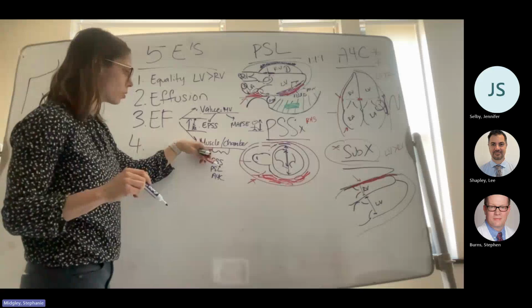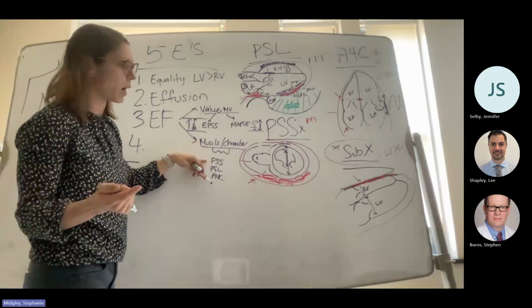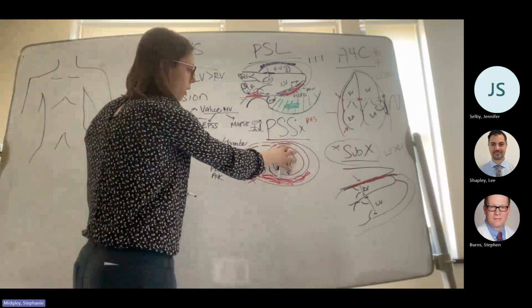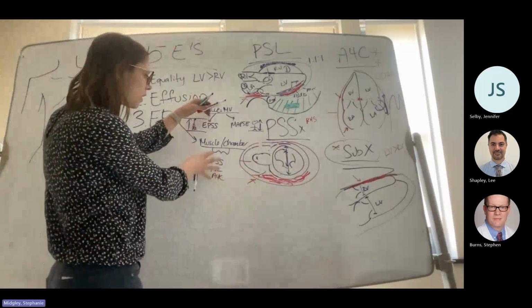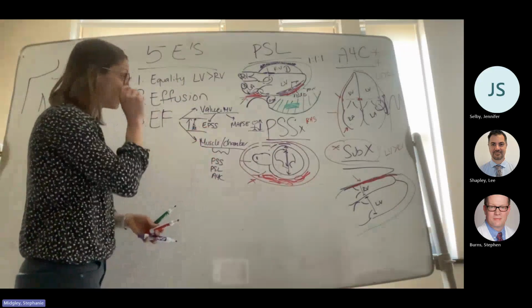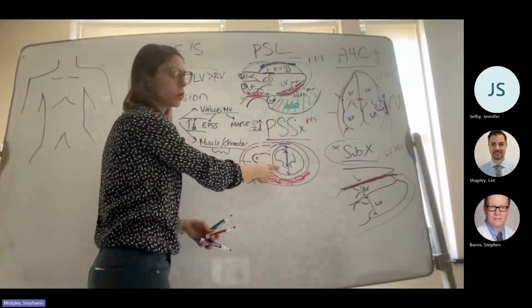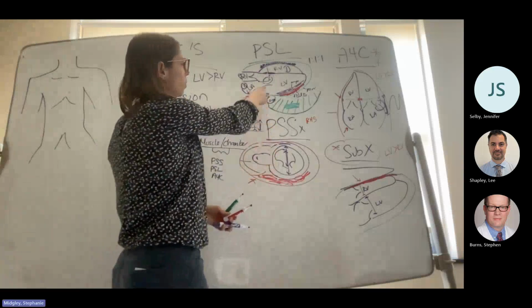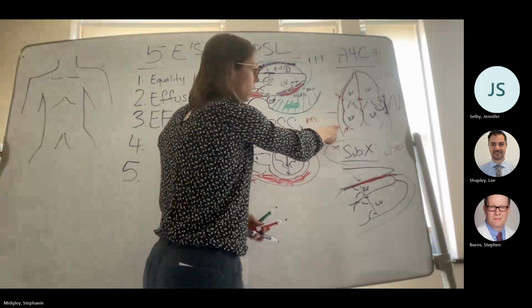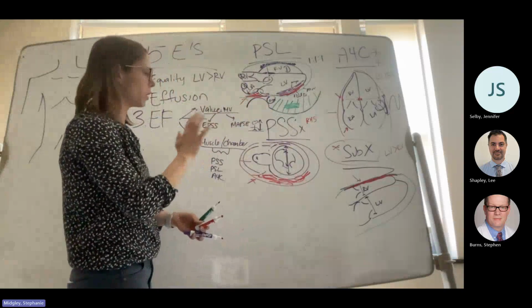If I'm looking just at muscle, if I have a bundle branch block, regional wall motion abnormality from prior MIs, if I'm paced, all of those are going to mess up just looking at the pure muscle. So both of these have to be taken into consideration when you're determining EF. And they should check back on each other. And then each view should check back. So if this view tells me the EF is super low, but I look at my parasternal short and my EF looks totally normal, then I'm like, okay, one of these views is incorrect. And so maybe I either need a third to be the tiebreaker, or I've got to go back and figure out what was wrong with my initial view that led me astray.